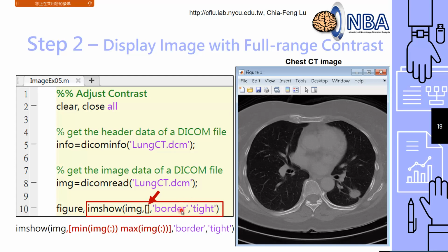It is very similar to what we did. So you will get this kind of image on hand. So just check whether you can run this script and whether you can see this figure with the correct image right here. And this is one of the slices of the CT in the chest. So try to observe it.